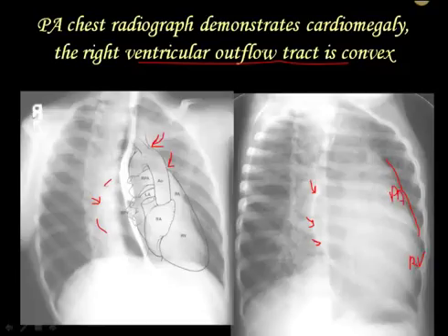And up in here, we're not seeing much of any of the aorta. A lot of this has to do with the previous image, where it's sort of obscured because the left atrium is enlarged. Now the left atrium, remember, is really back in here. And as you can see, in this one, which is relatively normal, it's pretty much off of the spine. Here, on the other hand, it is displaced because the left atrium is so big. It's displacing it.